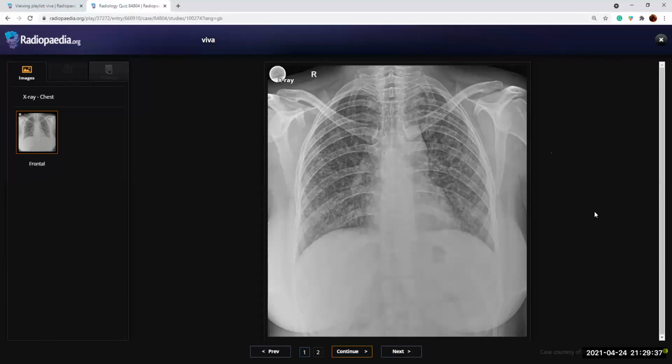This patient presented with cough. This is a frontal radiograph of the chest of an adult patient presenting with a cough. I can see there are bilateral diffuse abnormalities involving all the lung zones. There are faint, ill-defined nodules scattered randomly, and the cardiac borders are shaggy, and the diaphragmatic borders are also shaggy, and I cannot see any confluent consolidation or any collapse, and the tracheobronchial shadow looks fine, and the bones are unremarkable.